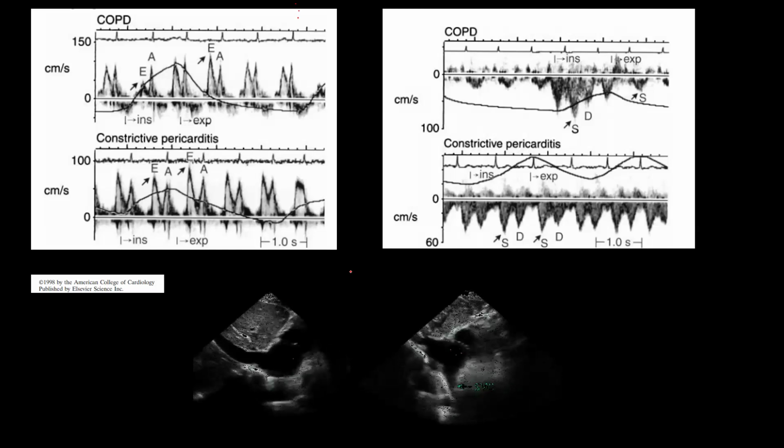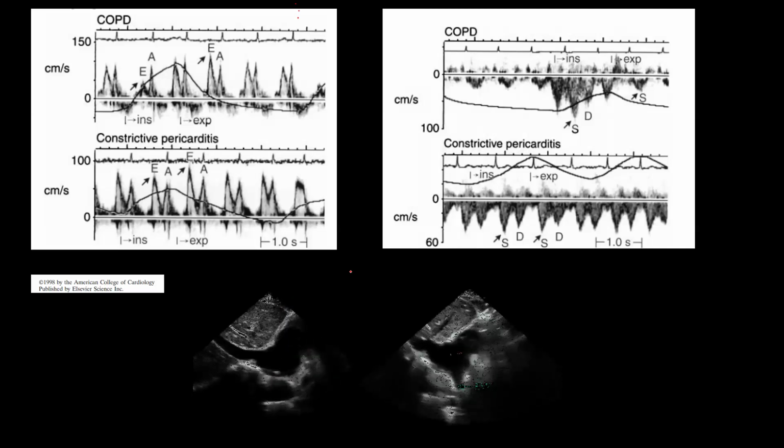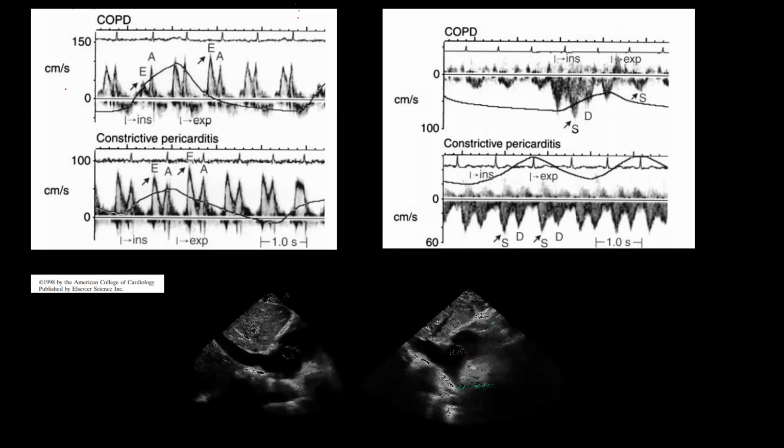But imagine that based on these echohemodynamics you diagnose constriction in a patient with COPD. See what the cost could be? The cost could be an irrelevant cardiac surgery. Therefore, you have to make sure this patient is not showing these hemodynamic changes because of COPD. And simply what we do is go to the SVC. Go for SVC. For example, here, notice with me guys. This is COPD.